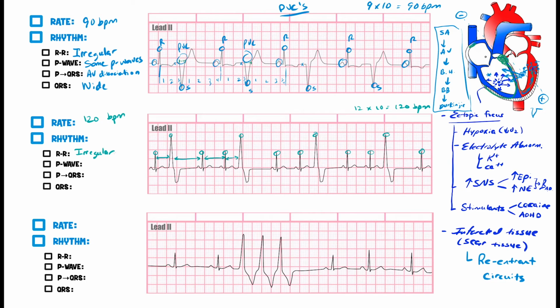Next, go to the P waves. Are they normal? Do you have P waves? Here's a P wave. Okay, this is a T wave here. I don't really see my P wave at all. There's no P wave. If it is, maybe it's kind of hidden within my QRS complex. It might be hidden in here, but I don't see it. Okay, so no P wave there. Then I go again, and I'm going to have another P wave, a normal one. Then I have a T wave. Then I have another P wave. Okay, cool. QRS complex. And then again, I go over here, I got a T wave, and oh, I don't see a P wave again.